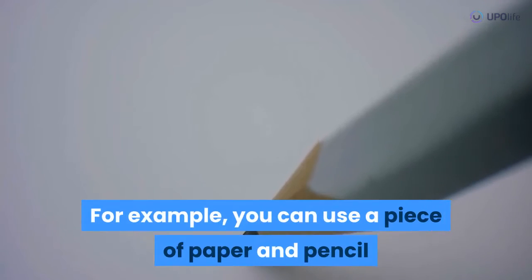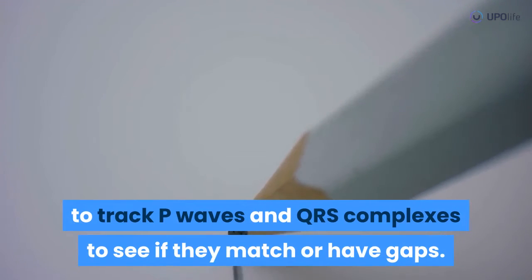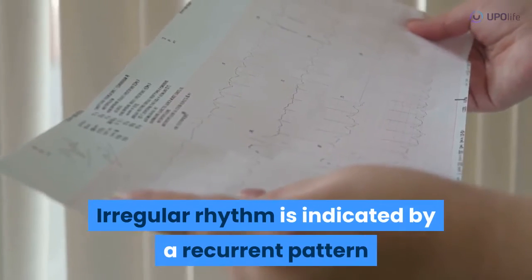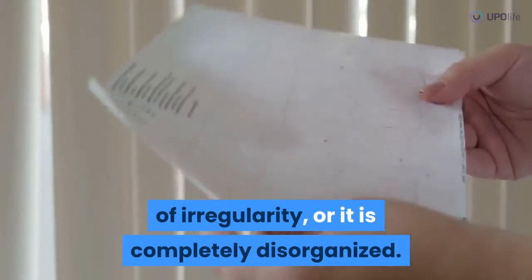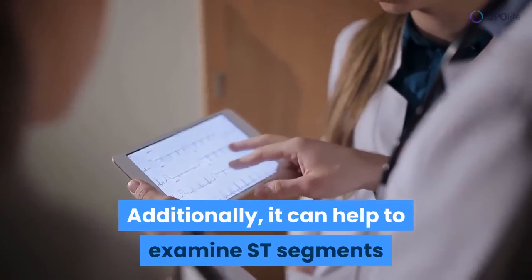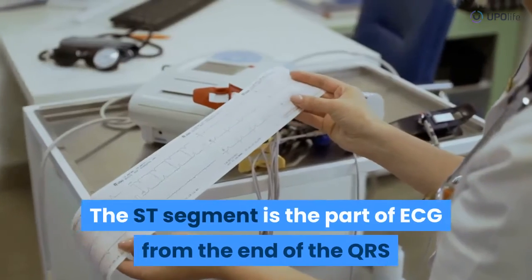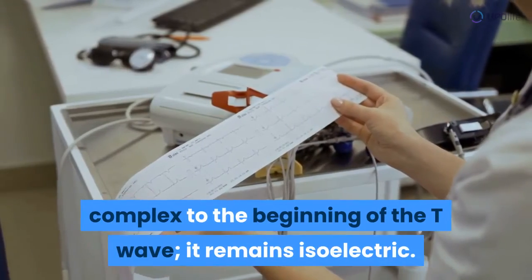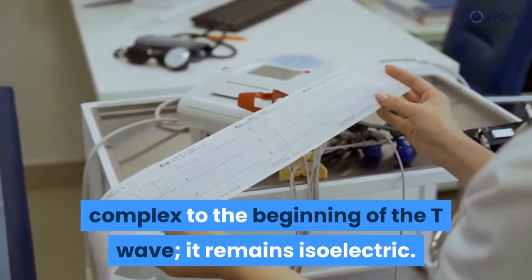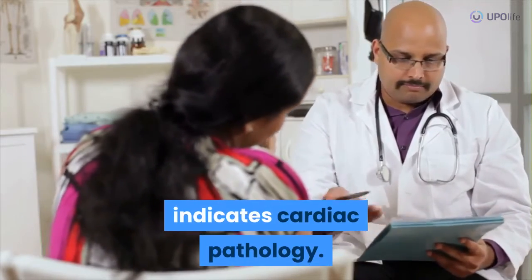For example, you can use a piece of paper and pencil to track P waves and QRS complexes to see if they match or have gaps. Irregular rhythm is indicated by a recurrent pattern of irregularity, or it is completely disorganized. Additionally, it can help to examine ST segments for any elevation or depression. The ST segment is the part of the ECG from the end of the QRS complex to the beginning of the T wave. It remains isoelectric. Elevation or depression of the ST segment indicates cardiac pathology.